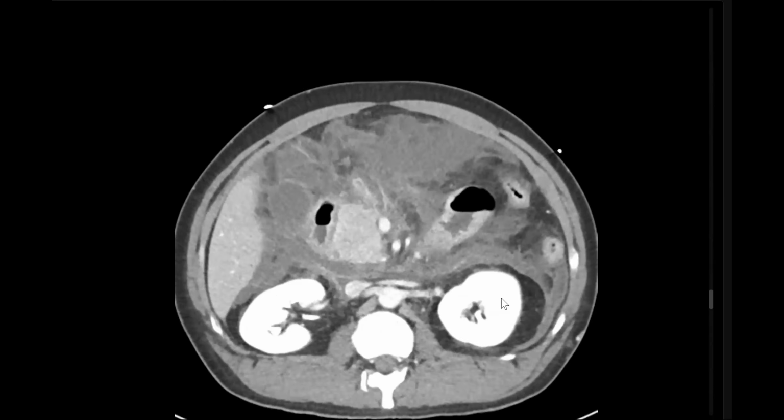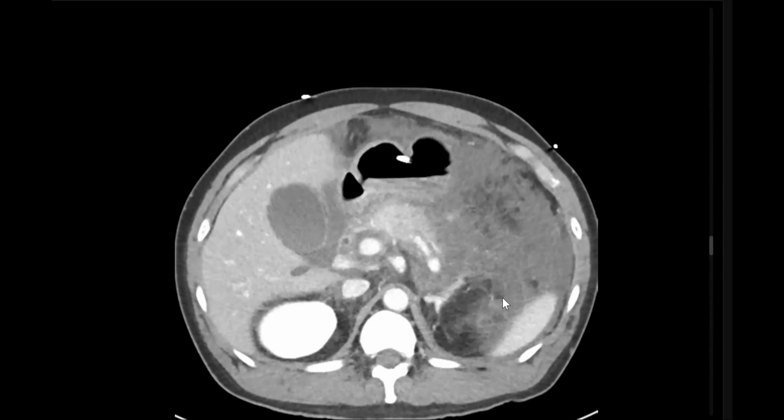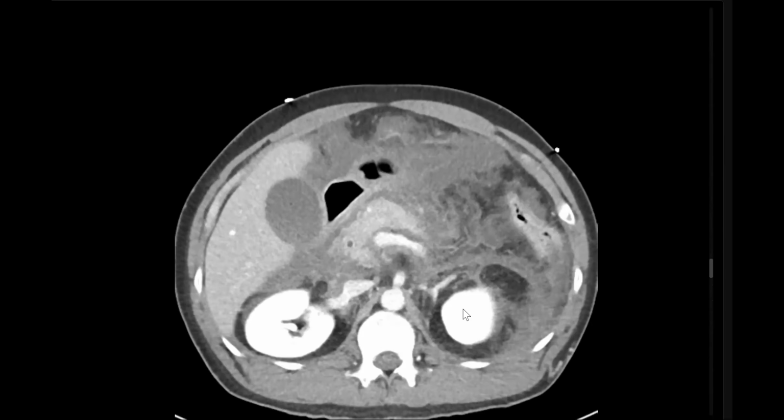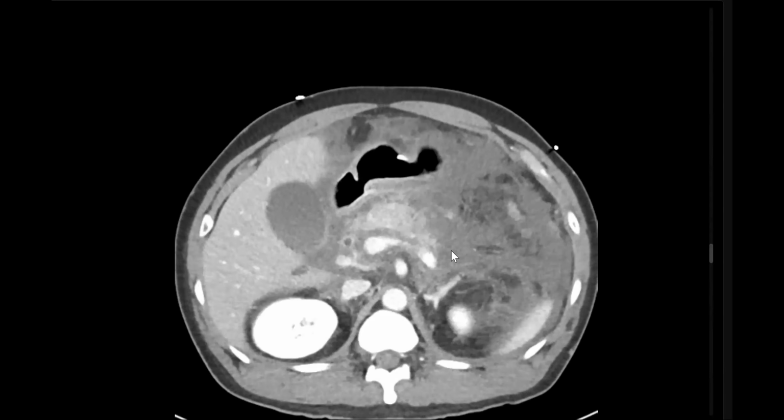the bilateral kidneys. So this is in keeping with shock. And the adrenals are also hyper-enhancing. So I think the patient is having hypoperfusion complex evident on imaging. Management: I would urgently convey my finding to the referring physician. The patient will need urgent surgical referral.